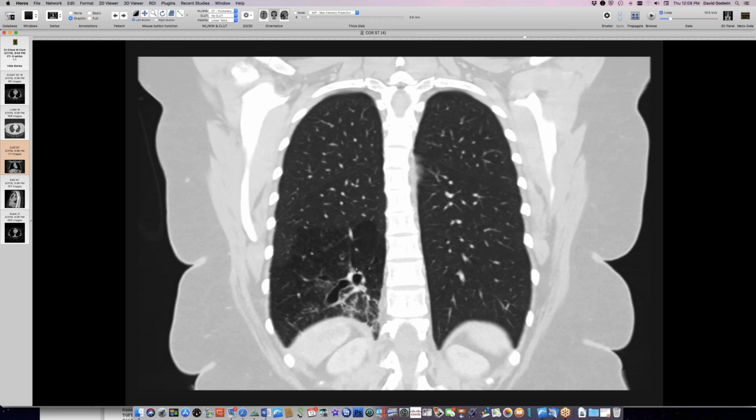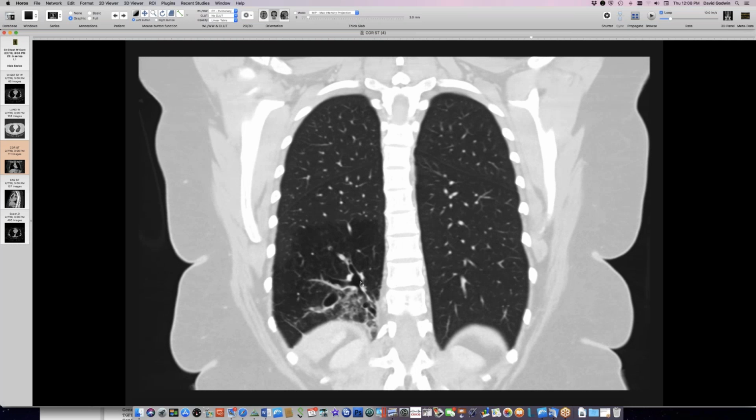And they described cysts lined by bronchial epithelium or endothelium. So this is a very nice sequestration in showing definite bronchial forms here, sort of rudimentary bronchi. I've never seen this before. So I don't know that you guys have encountered something like this that really looks like bronchi, the sequestration, rather than just some big cysts.